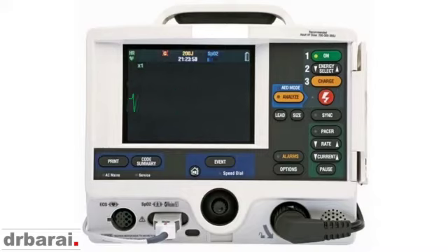Now, what will you do in this patient? It depends. If the patient is hemodynamically unstable, the first thing obviously is to get a 12-lead ECG, identify why this is happening, and also consider transcutaneous pacing. For transcutaneous pacing, we need to give some sedation, obviously take the consent, and start pacing.